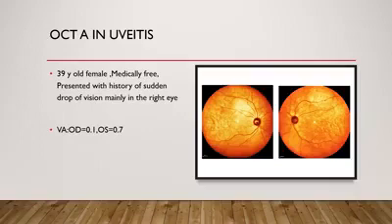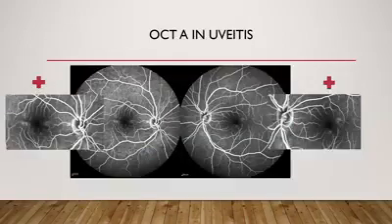She went to the public sector and did the fluorescein angiography. This is the false color image of the Heidelberg for the fundus. This is the fluorescein angiography. And if you look carefully at the late phase, you can see that there is perifoveal vascular staining.